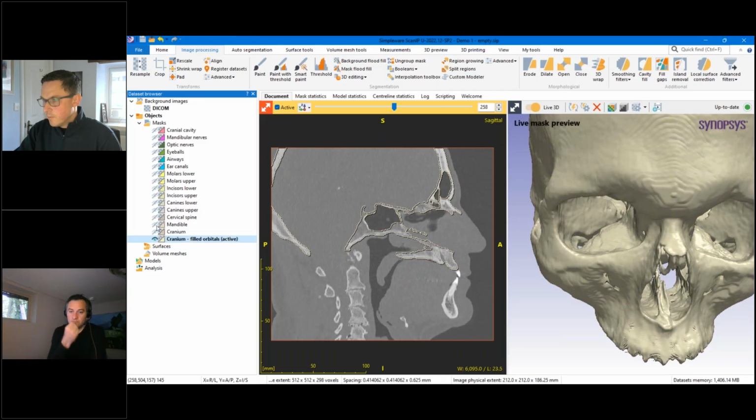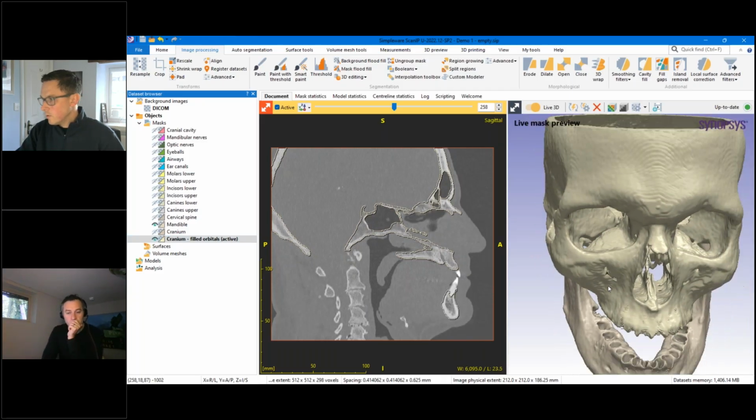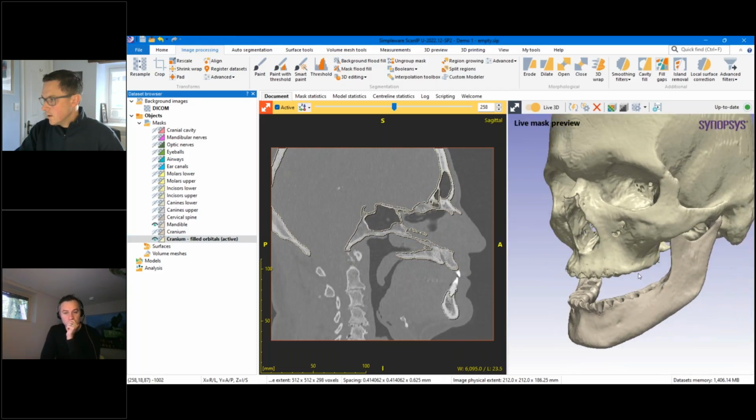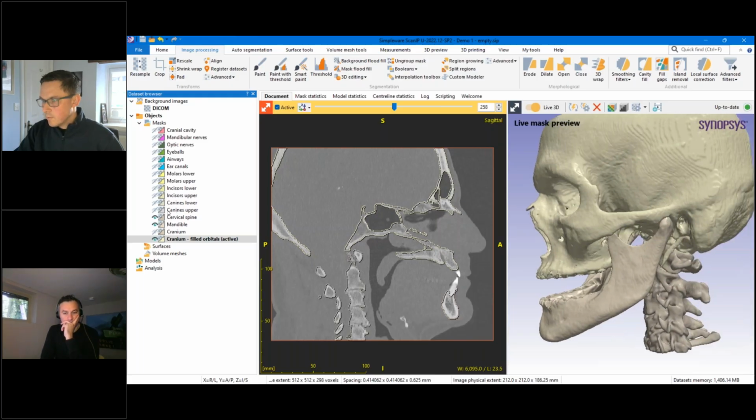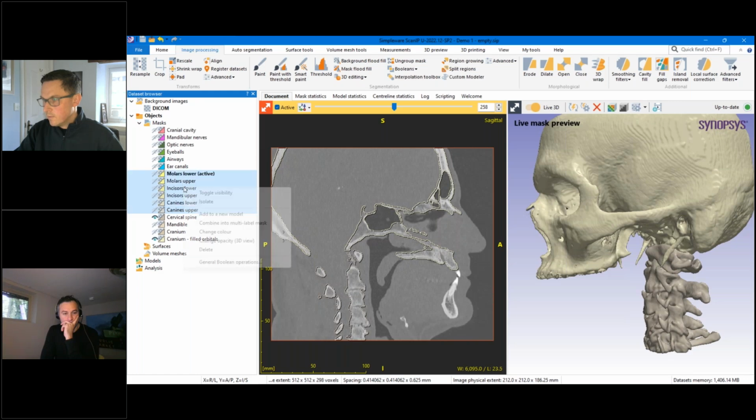So we'll continue on. The mandible, obviously, is the next one. Again, we're not seeing the teeth just yet, but there we go. There's the mandible split from the cranium. Spine at the back. It's pretty simple. And then we can look at the teeth. For the teeth, I will just turn off the mandible for now, and we can look at adding in all the groups here.